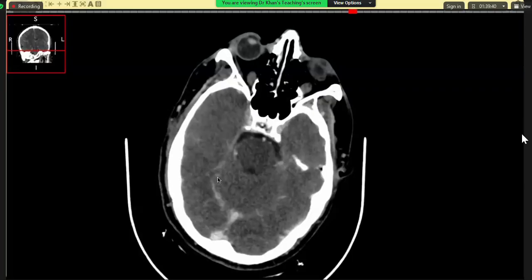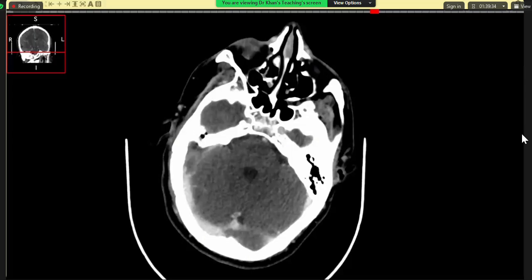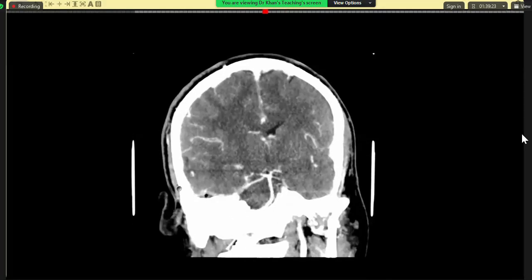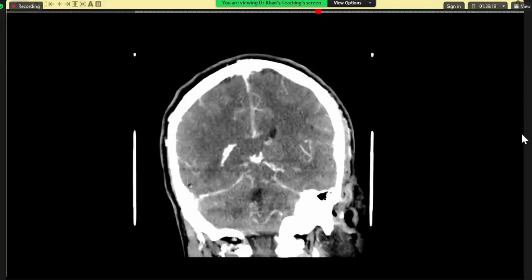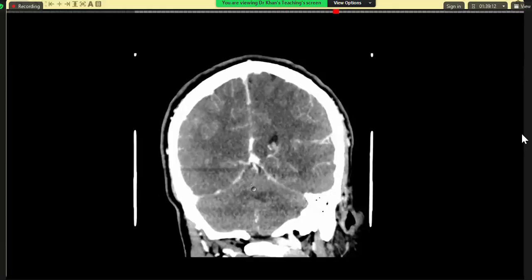There is an epidural abscess also in this region. So you could have asked for a coronal, etc., just like your day to day. Think as if you are reporting it in your day to day. And do you see that there is an epidural abscess here? You can see a bit of gas. So there was an epidural abscess with sigmoid sinus thrombosis. Otherwise, you did well.